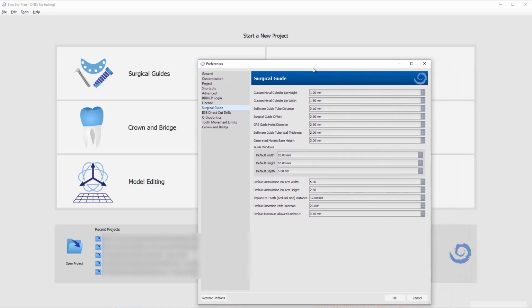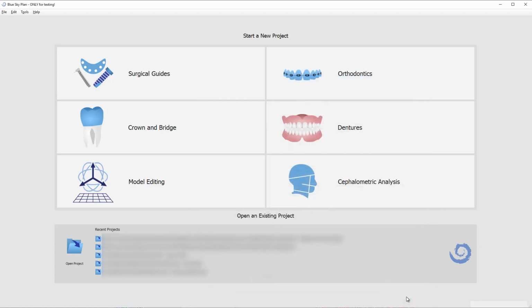In the advanced workflow, you can actually customize it to each individual patient. In the wizard workflow, you do not have that opportunity. So leave it. I would recommend you change it to 20, but you don't have to. That's just my personal preference. Okay. So anyway, that's it for this video. Hopefully this is helpful on the wizard workflow, and that'll get you started on your more simple cases.